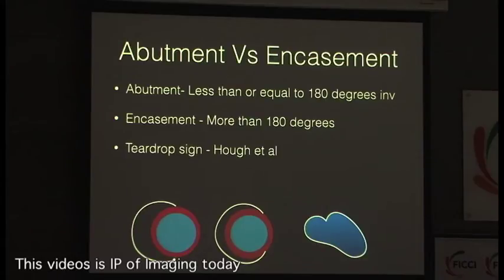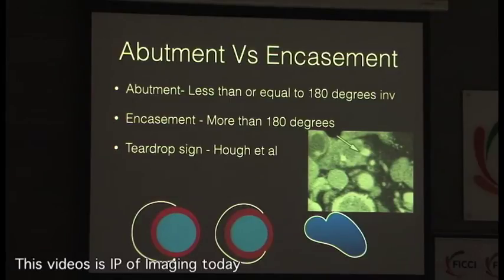As far as veins go, if there is distortion of the vein, or you can see obvious tumor in the vein, then you can say that this vein is going to be involved. If it just abuts the vein with less than 180 degrees and no distortion, the vein is less likely to be involved. And this is what I could get out of all the papers that I read on this subject. So that you see that vein being pulled medially, that vein losing its nice shape, being pulled like a beak, that means that this vein is involved.